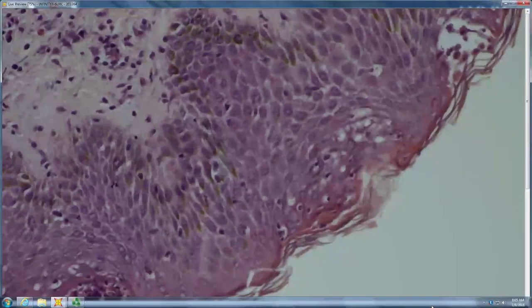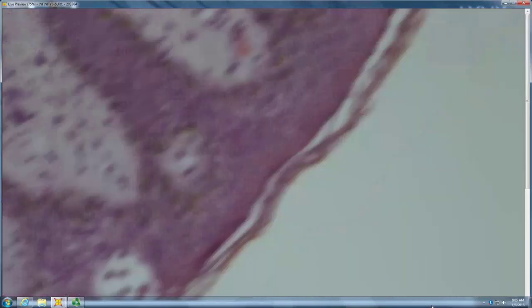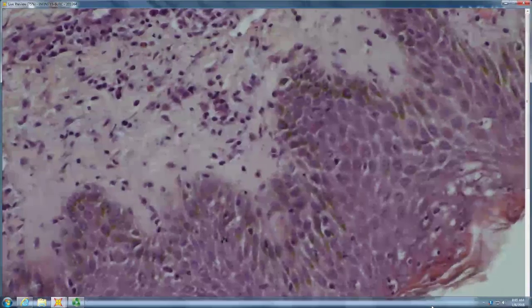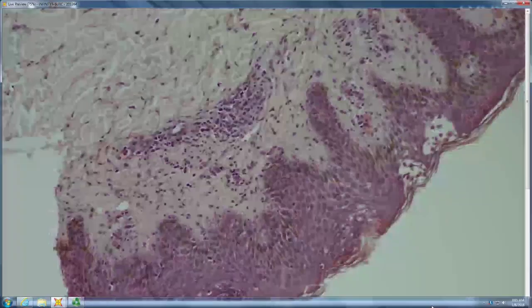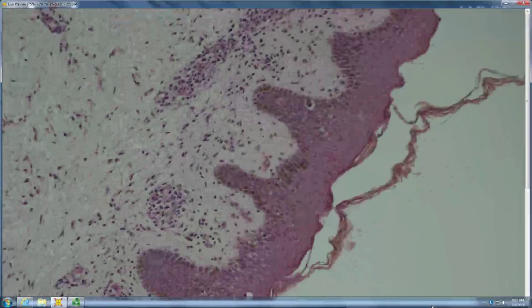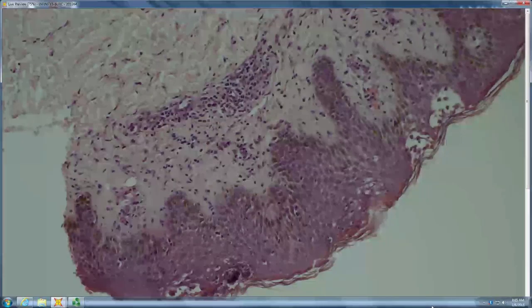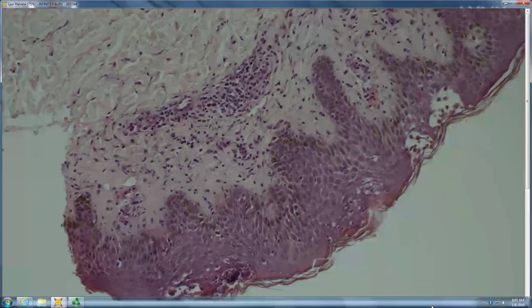There's some sort of inflammation. It's like neutrophils in the horn. Yeah. So you have spongiosis and you have neutrophils in the horn. You also have Langerhans cell granuloma that just goes with the spongiosis, right? So you got spongiotic dermatitis and then neutrophils in the horn. You got some eosinophils in the tissue. So the differential for neutrophils in the horn is psoriasis. Well, can psoriasis be spongiotic? Oh yeah. Anything other than plaque psoriasis, right? All the other forms can.